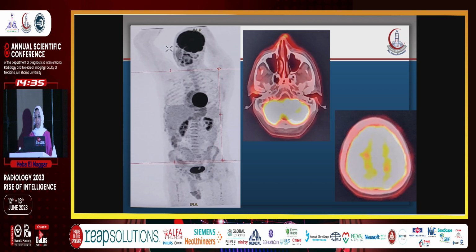And here, the first case, this is a lymphoma patient who was in complete remission for more than 18 months and was referred for his routine follow-up PET-CT at our unit. As you can see from the MIP image, the first one, the black and white one, it looks unremarkable apart from the hyperactive bone marrow. But is this study sufficient to judge the brain parenchymal uptake?